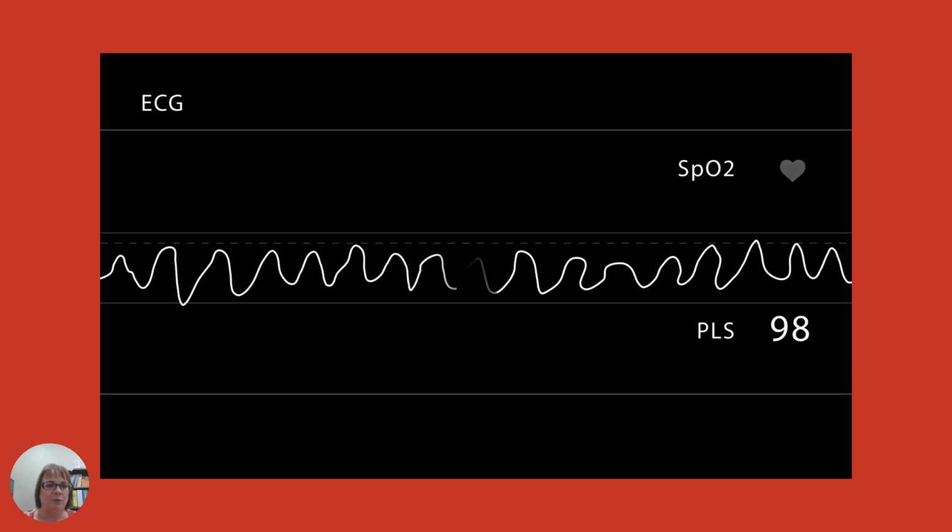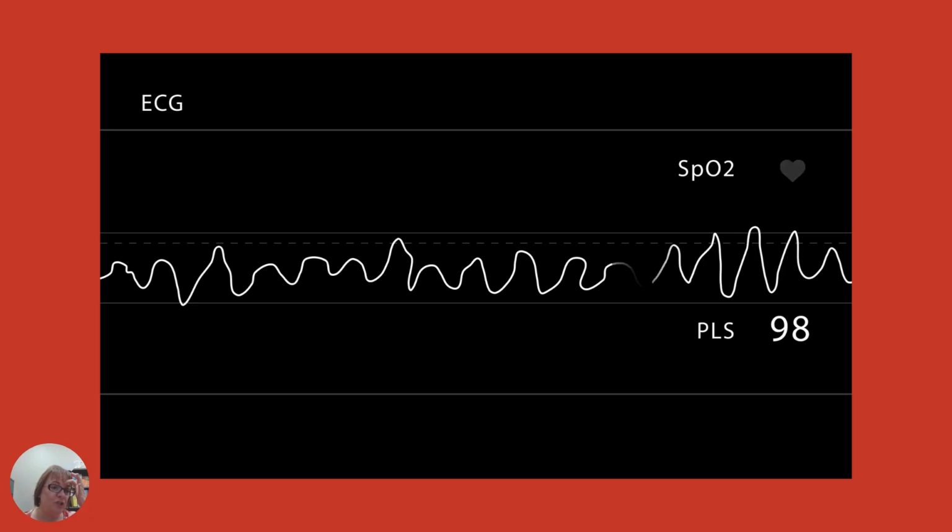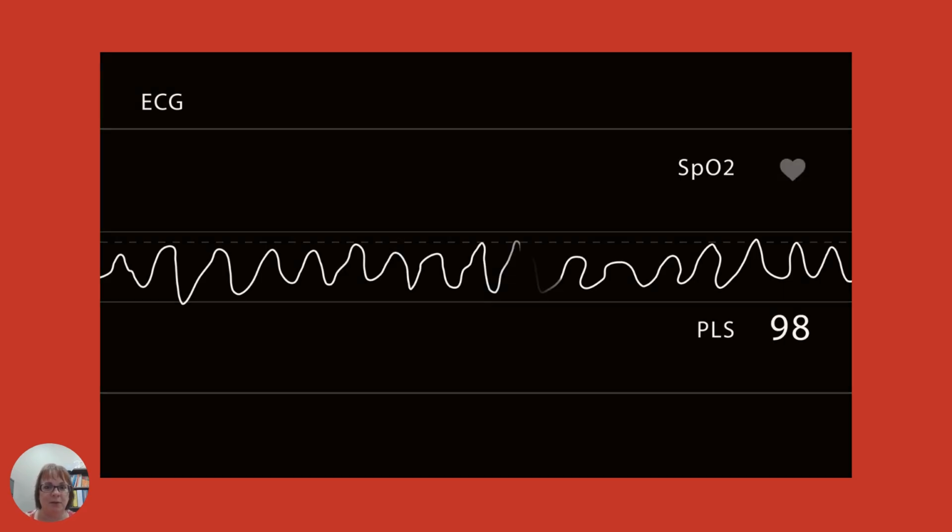And here's an example of VFib. Definitely need to shock them to bring this person back to life. So it's important to know which rhythms are lethal, what you need to go really run to the room for. And this is definitely one of them.